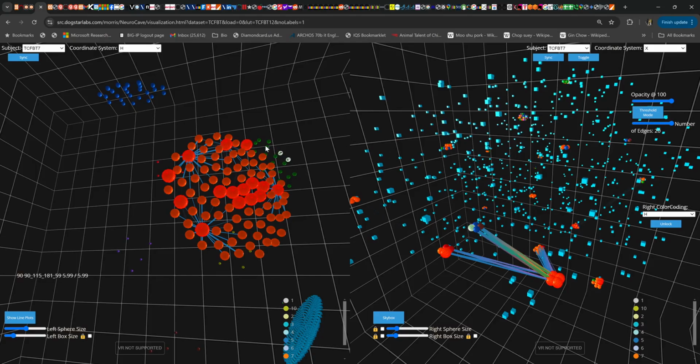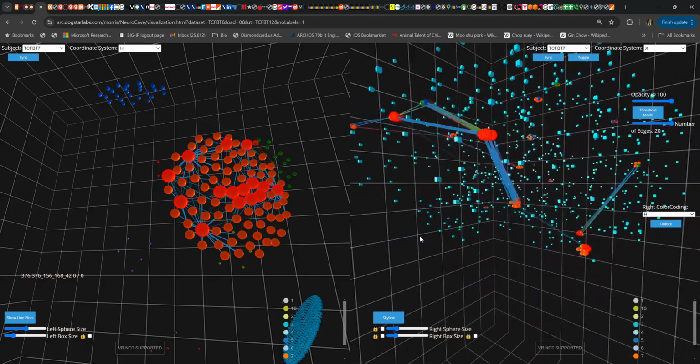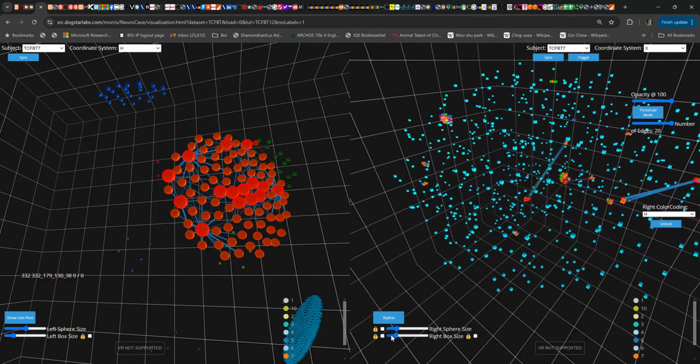See, this cluster seems to have a very high centrality. You can see how that cluster is oriented in the tumor's anatomy.